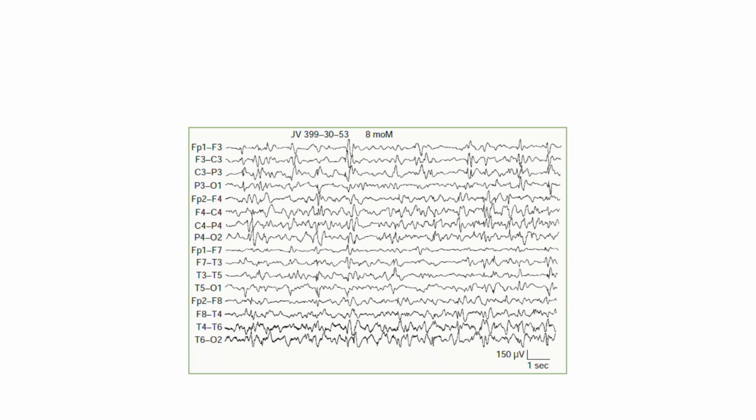The scale is set to 150 µV, double the voltage scale of the first generalized tracing, 75 µV, and triple that of the focal tracing, 50 µV. Despite this reduced sensitivity, the waves still dominate the page.